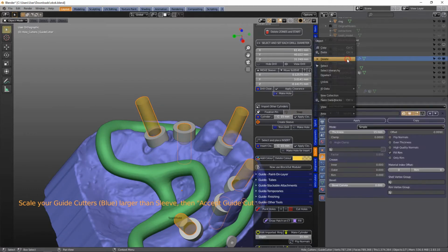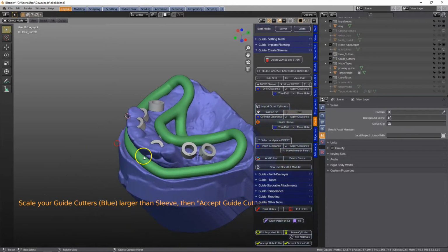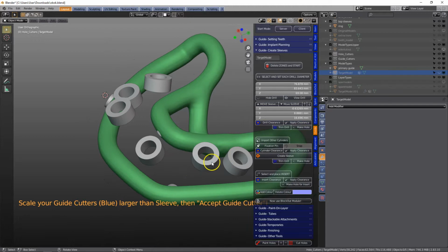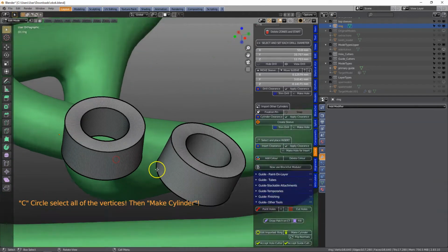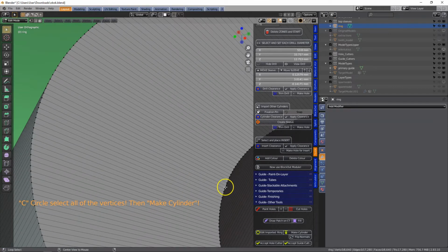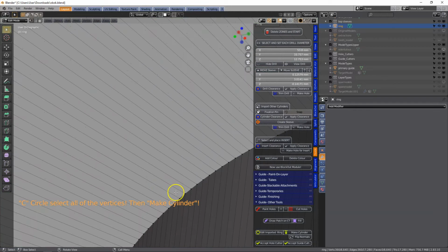So I'm going to delete this. Okay, so this is, say, freshly imported from another DICOM planning. Let's hide this model, and I'm going to go to this one, imported ring, and then we're going to zoom in, and I'm going to alt left click to select that edge loop, go close in between the two vertices, shift alt left click.